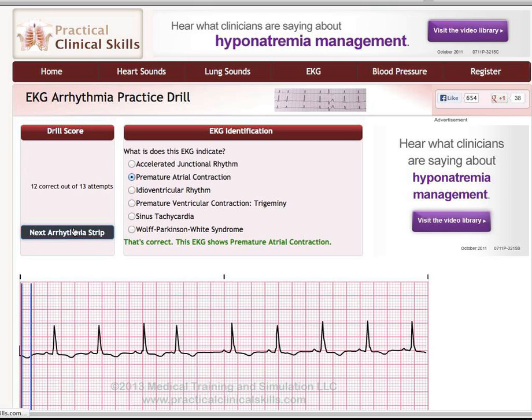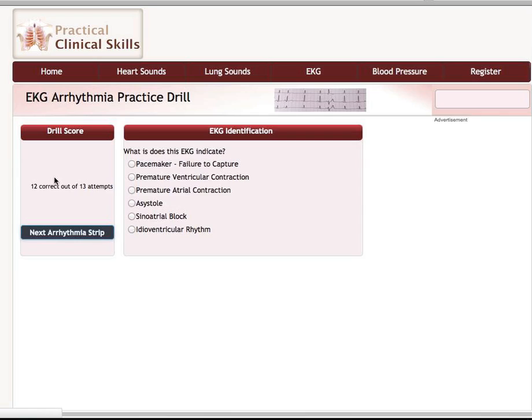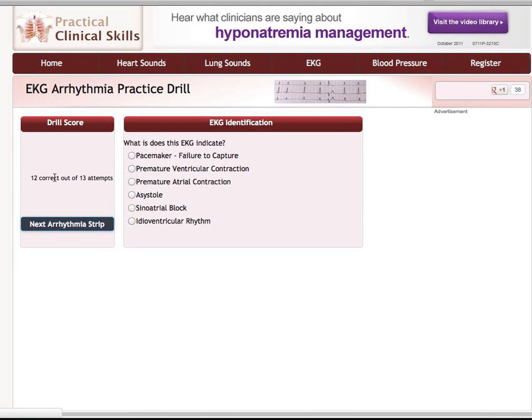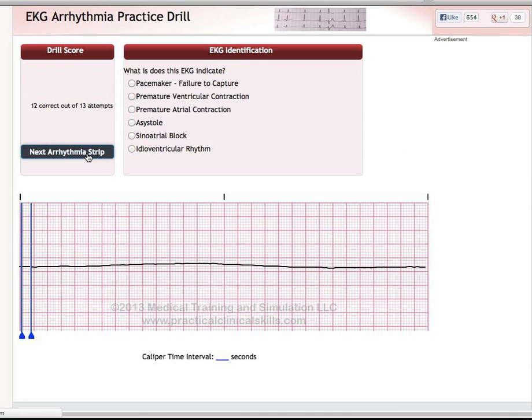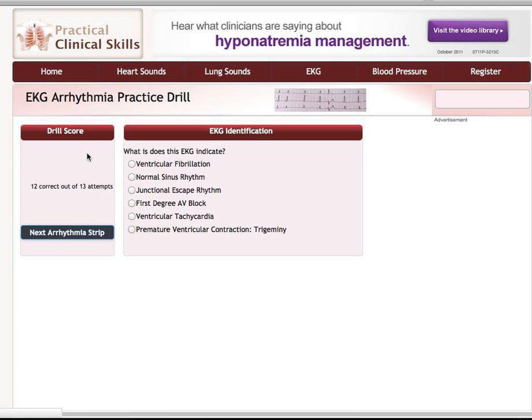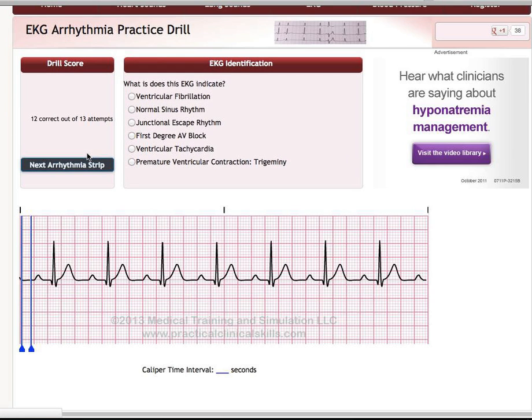All right, we'll do one more, and then I'll call this video completed, and maybe we'll do another one if you guys like these. You seem to like all the other ones I've done. We already have done this one, so we'll just skip this. Everybody knows what that is, right? That's asystole, which means without systolic contraction.